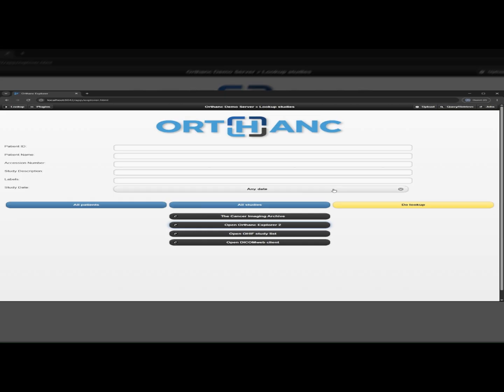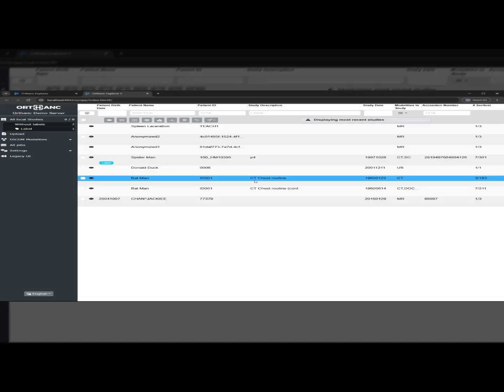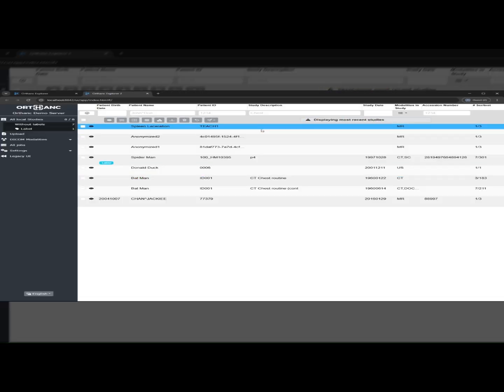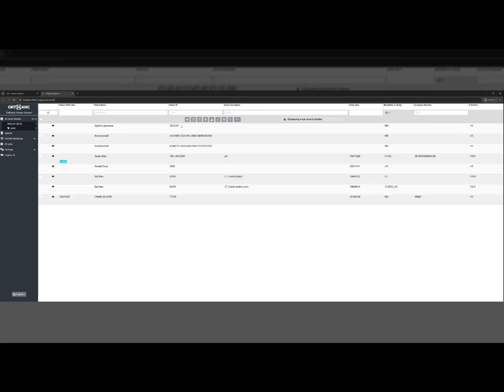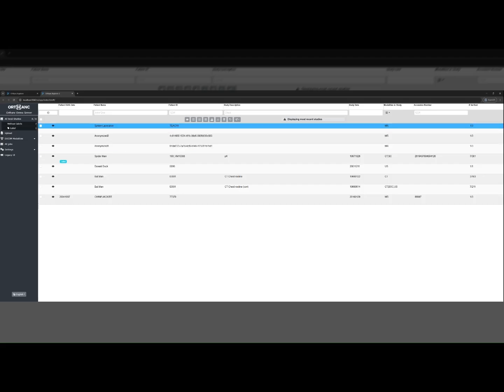Well, what happens is that in most cases, you would start with Orthanc Explorer 2. That's the interface that's usually well known and familiar to most. Now, what's happening here is that this is what truly kind of resembles a work list that one may see on PACS, although there's some pretty significant caveats here. This is more of a study list that doesn't really resemble a true work list because there's not really much logic in here, but nonetheless, at least it looks similar and it's kind of easier to navigate.